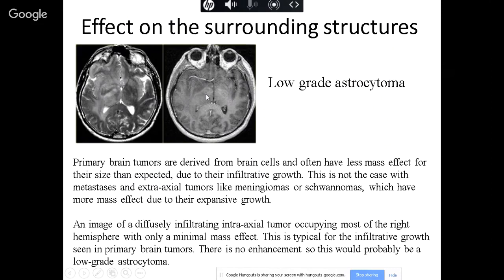So this is very characteristic of low-grade astrocytoma. Remember, astrocytomas have an infiltrative nature. They do not break down the blood-brain barrier. That's why it's not contrast enhanced. And the tumor is much larger than what you saw on the imaging study. So that's why it's very difficult to do surgery to get a resection. So that's the reason.